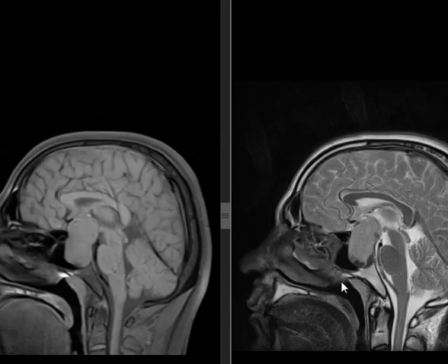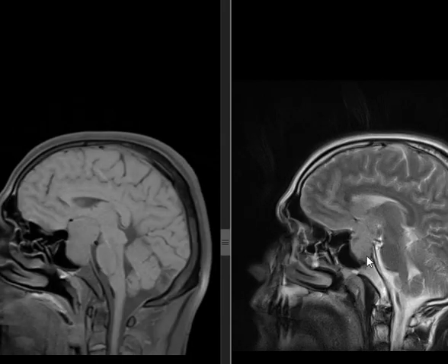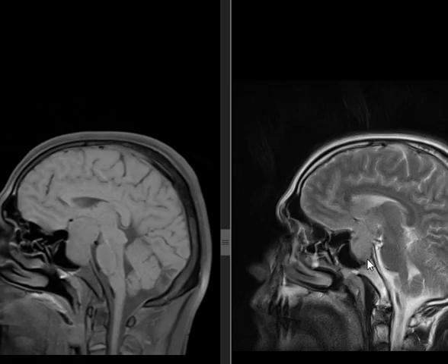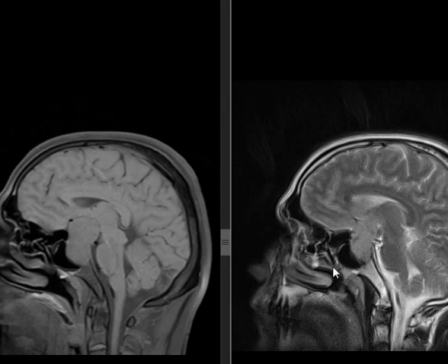No. Okay, it's not invading. Is it expansile? Yes, expansile lesion. Expansile of what? What does it expand? The sella turcica is expanded. Excellent. And it's passing into the suprasellar region.